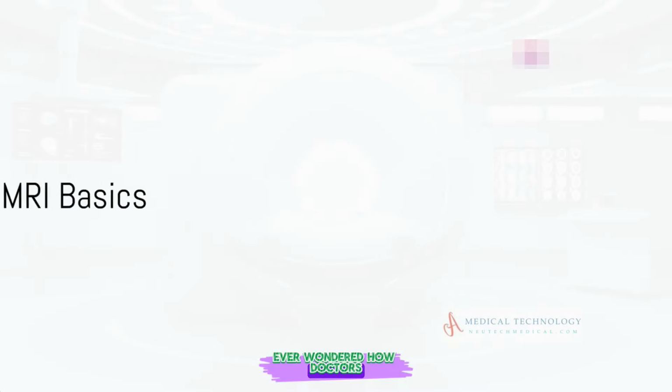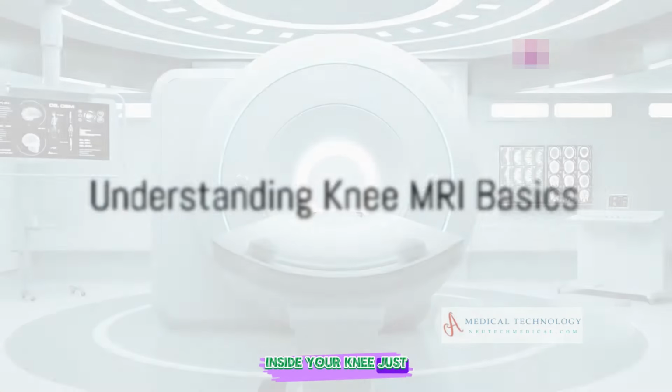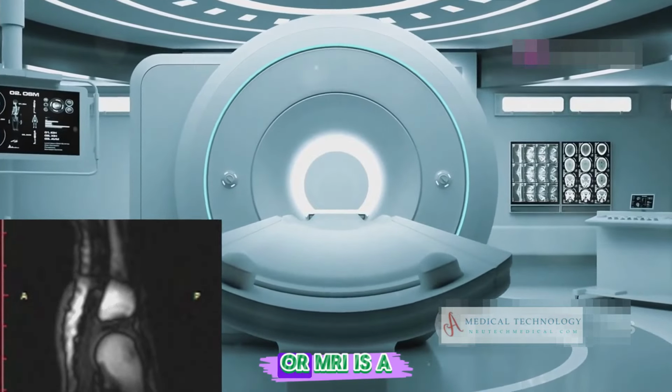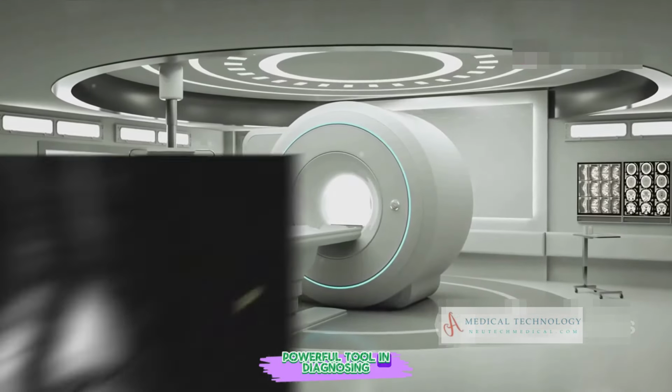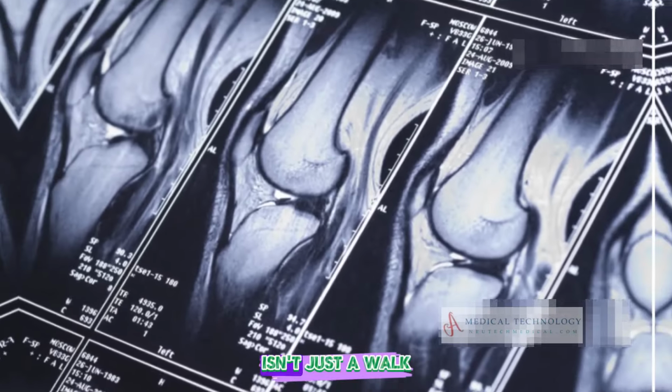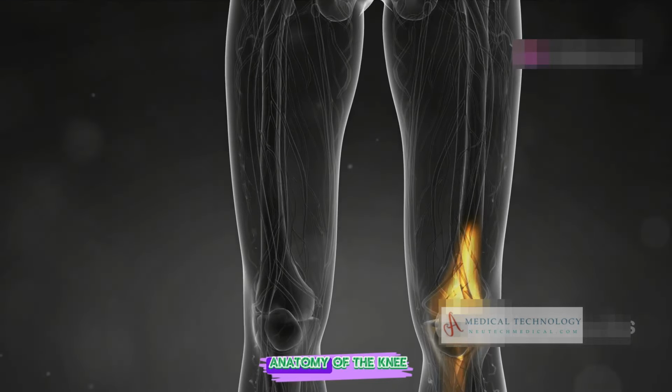Ever wondered how doctors can tell what's wrong inside your knee just by looking at an MRI? Magnetic resonance imaging, or MRI, is a powerful tool in diagnosing knee injuries, but understanding its complexity isn't just a walk in the park. First, grasp the basic anatomy of the knee.